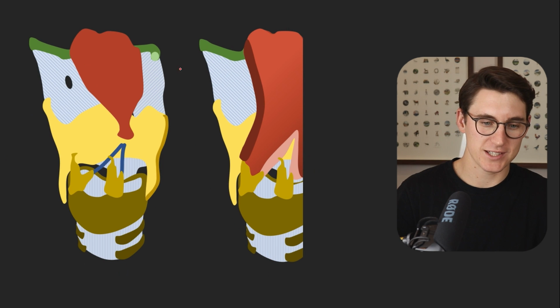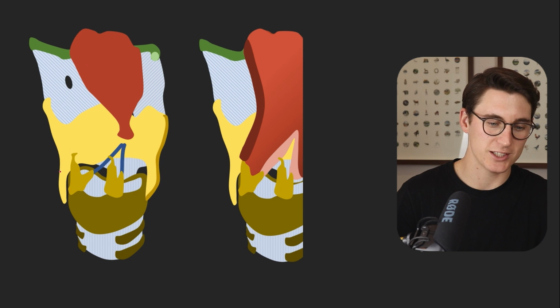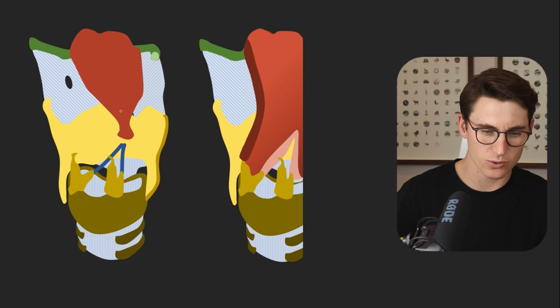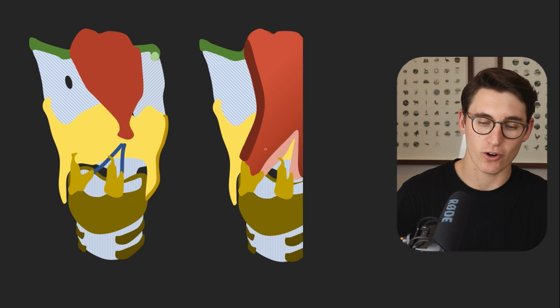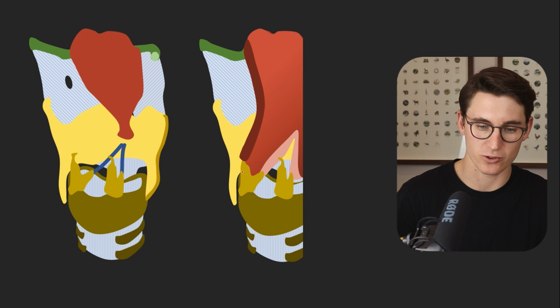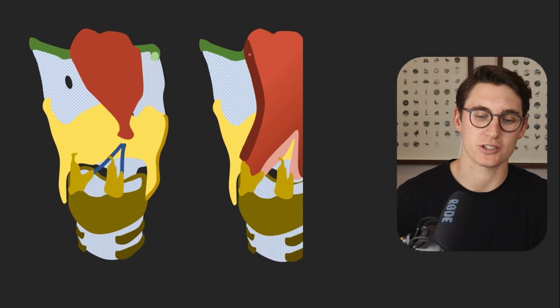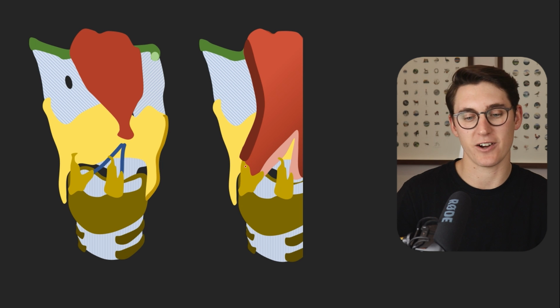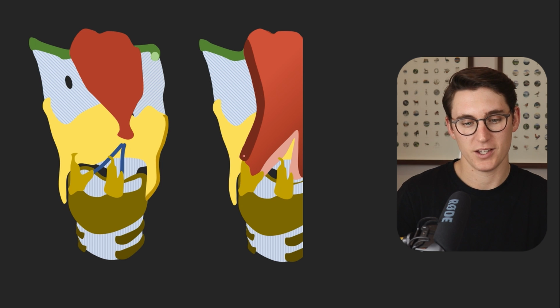So let's move on. This is the image that we have seen now, that we've examined. And there's some soft tissue that drapes between these arytenoid cartilages and the epiglottis itself. So I've cut away this section of diagram here, and I've overlaid this soft tissue, or this mucosal membrane that wraps from the arytenoids heading up all the way to the epiglottis. So this fold of soft tissue that drapes between the superior process of the arytenoid and the epiglottis is known as our aryepiglottic fold.